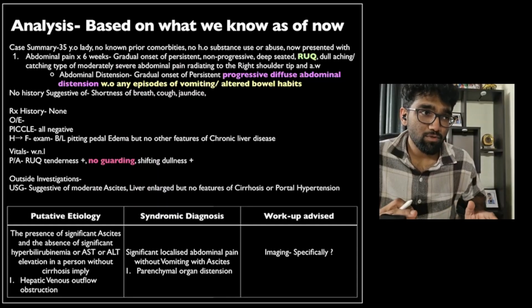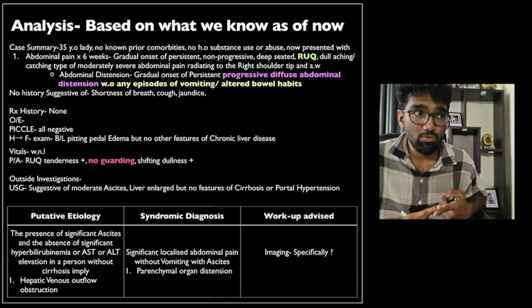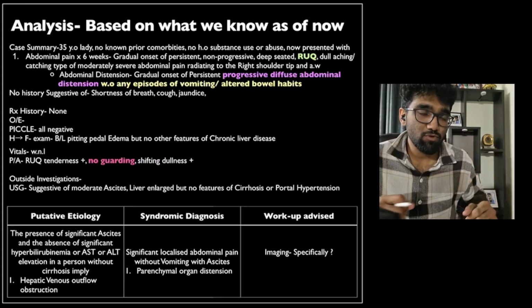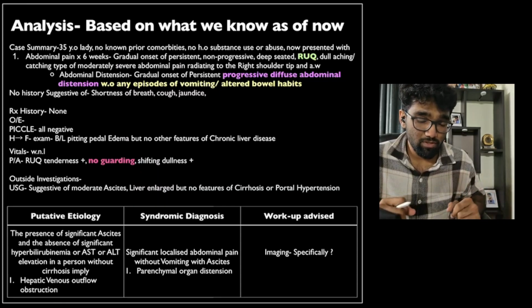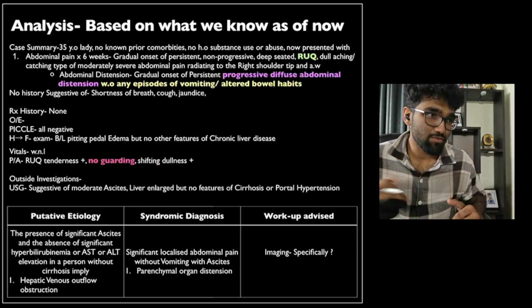That would give me an idea. That would allow me to differentiate between the three possible causes. That is hepatic venous outflow obstruction due to right atrial pressure elevation, in which case, as we've seen, there will be a change in the waveform; hepatic venous obstruction, in which case in that hepatic vein there may be no waveform at all; and sinusoidal obstruction syndrome, in which case the waveform will be completely normal.